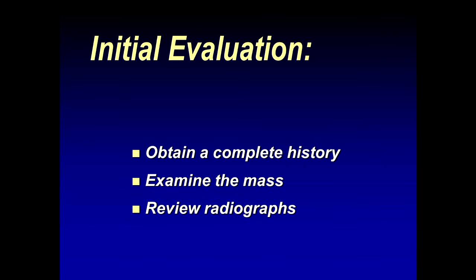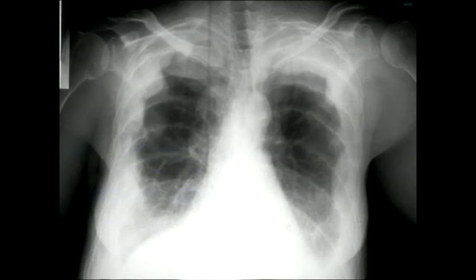And then I always like to review the radiographs, or if an ultrasound was done prior to the MR imaging, those images as well. They should be part of your routine evaluation prior to MR imaging. As radiologists, we're often told to take cases as unknowns, and we'd look at this and say, yes, I certainly see the ribs with some scalloping. I see the multiple lobulated pleural-based masses, and I'd be very pleased with myself to make the diagnosis of neurofibromatosis. And here, shown at autopsy, we can see these neurofibromas running along the inferior margins of the ribs.